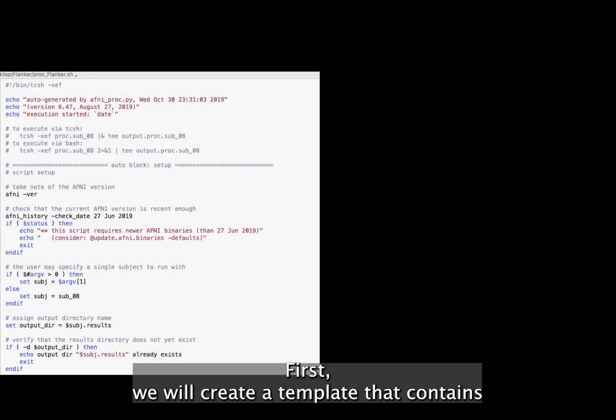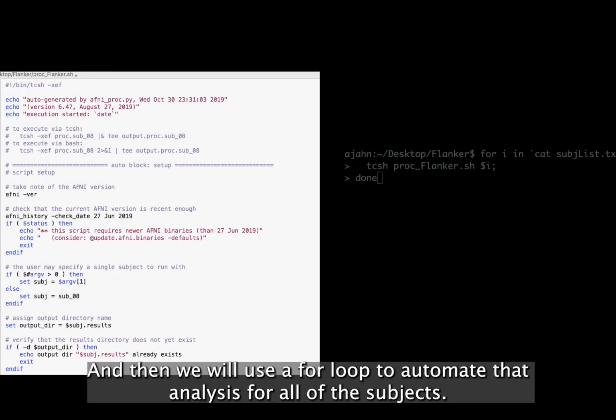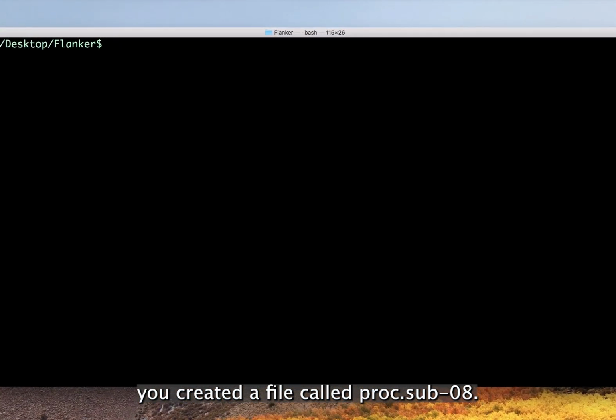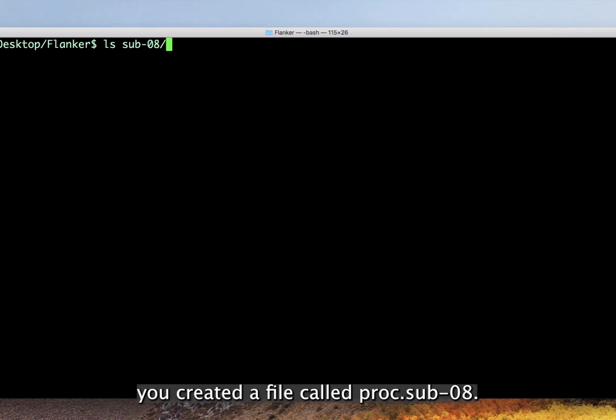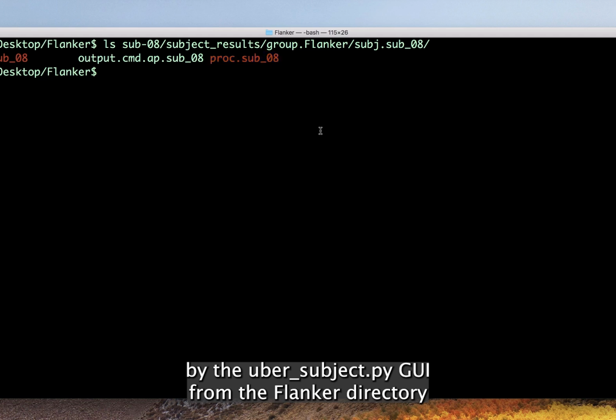First, we will create a template that contains the code needed to analyze a single subject, and then we will use a for loop to automate that analysis for all of the subjects. When you analyzed sub08, you created a file called proc.sub08. This contained a list of Afni commands composed in a manner determined by the ubersubject.py GUI.